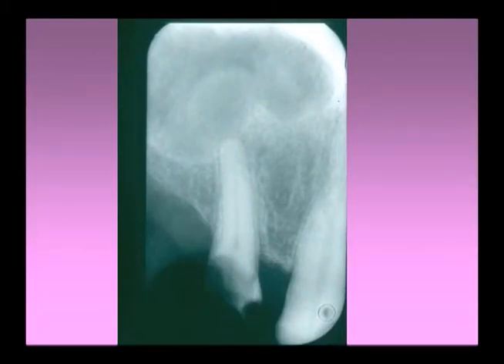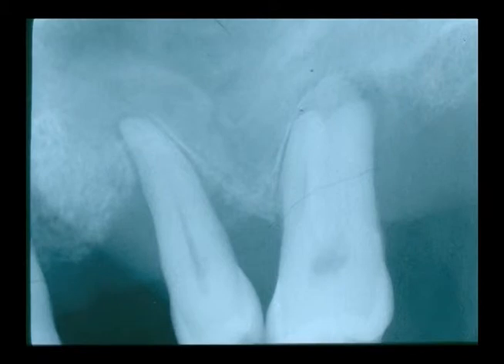Another area, a badly broken down tooth with the apex quite proximal to the maxillary sinus, and one can see an opacity of the insult of the mucosa in that region. Remembering always that besides the insult that we discussed relative to caries or restorative insult, periodontal insult can also present a rarefying osteitis. In this case, we see a bicuspid tooth, which indeed is displaying a mucositis on the floor of the maxillary sinus. The cause is a significant bone loss of periodontal disease, both in the bicuspid, and one can also observe it in the molar tooth.